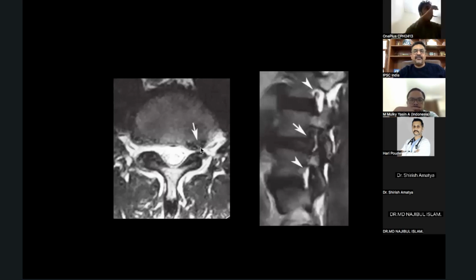You can see here, this is a good example of an absolutely foramen herniation. Let me tell you, most of the time, you may not see such kind of absolute foramen herniation. Most of the time, we have a paracentral herniation which is extending into the foramen. So paracentral extending into the foramen, that is the most common type of herniation. If it is an absolutely foramen herniation, you can see here on the sagittal section, when the section is taken from the foramen, like this from here, we can see this bulging disc over here.